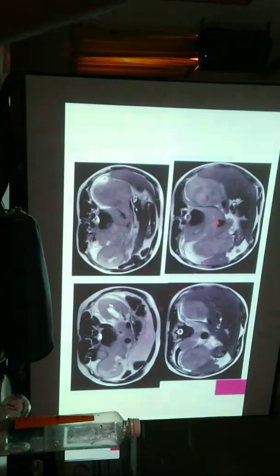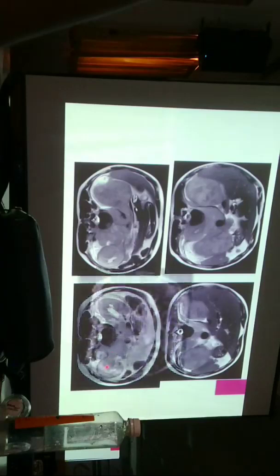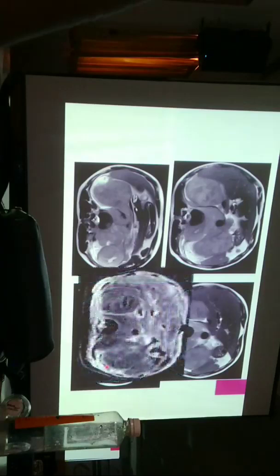And here again, this is the MR of the patient that shows the aorta is being displaced anteriorly. The same patient was seen in CT, and there is involvement of the kidneys by contiguous extension. The diffusion imaging shows significantly low ADC values. So diffusion imaging is also useful to assess the response of tumors after chemotherapy, especially in cases of lymphomas, where the ADC values can be useful as a biomarker to assess the response to chemotherapy. So in any patient who has a lymphoma renal tumor, we have baseline ADC values which may be useful for response later on.